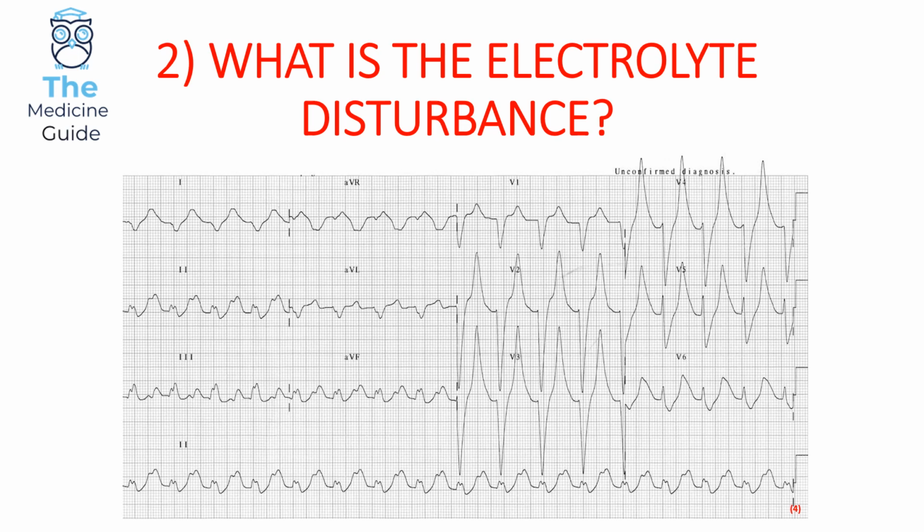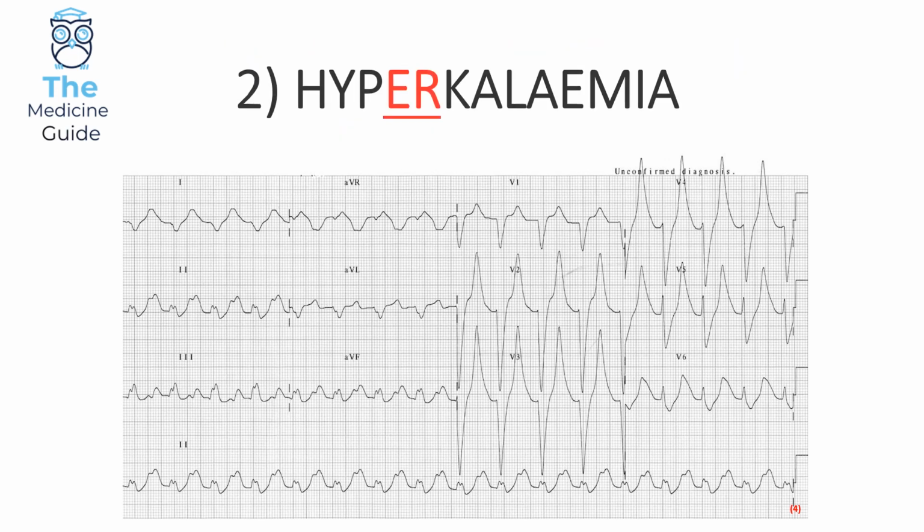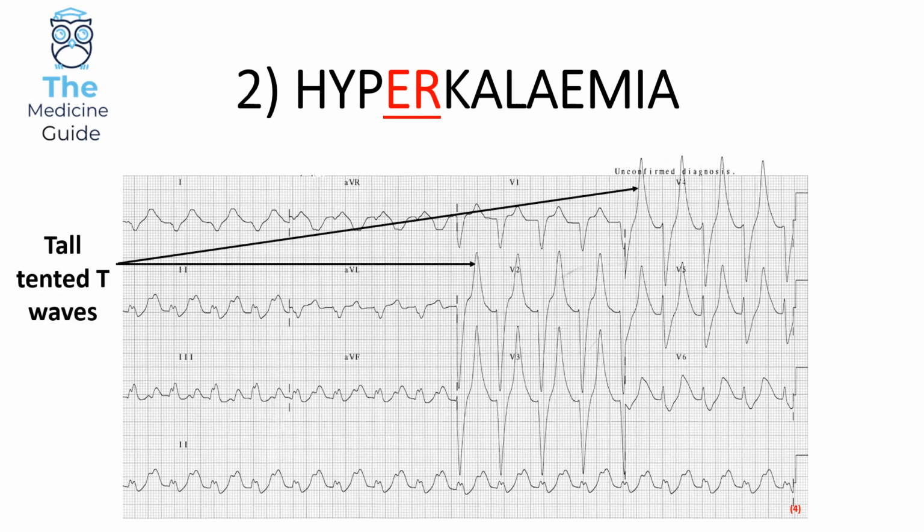Okay, so let's have a look at the answer. This is an example of hyperkalemia. The first thing that I saw when I looked at this ECG was the tall tented T waves, and this is very classic for hyperkalemia.